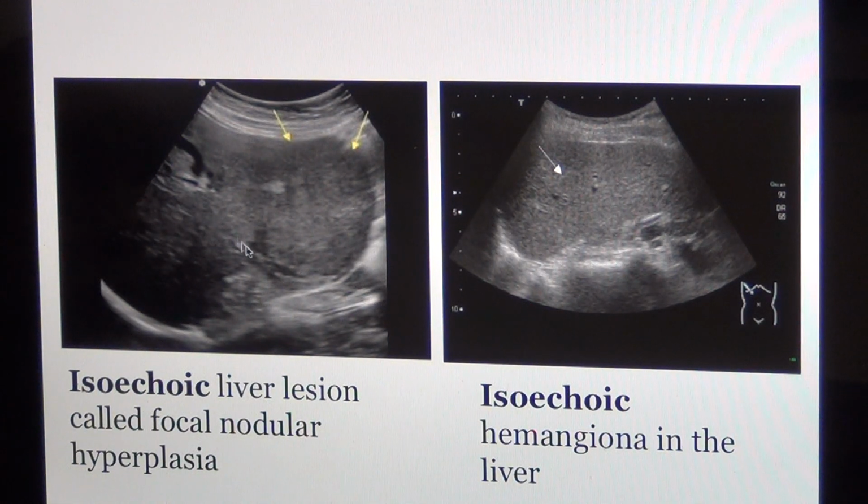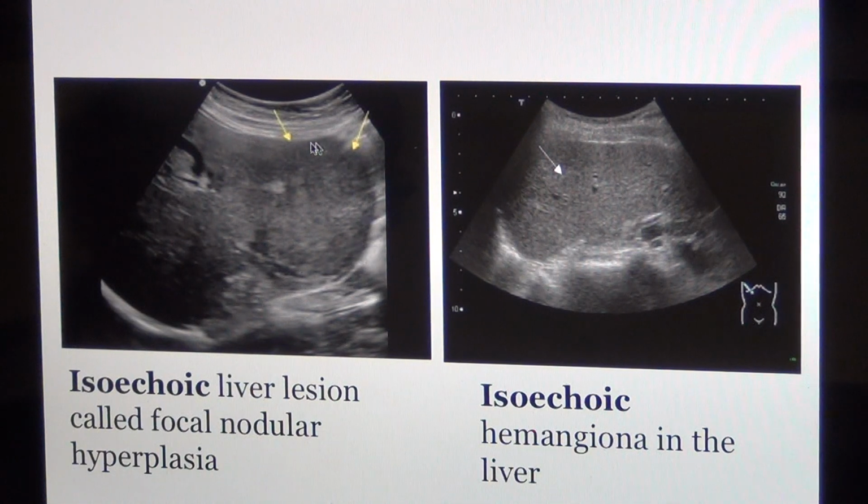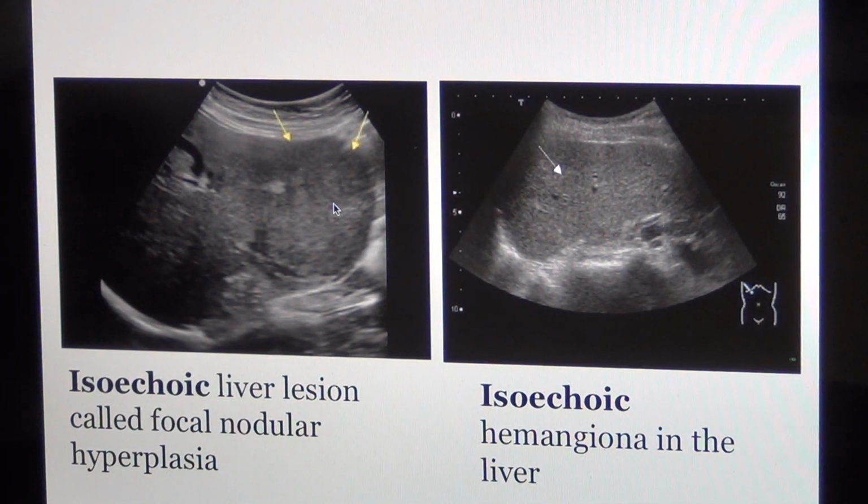A competent sonographer's eye will tell you, if you go a little farther, then you will see, oh, it looks like there is something. There is something because it is a hyperplasia. The increased number of cells in here gives a little tightness, little changes of the echogenicity, but it is close to the liver too. Okay, it is isoechoic. Iso means same looking.